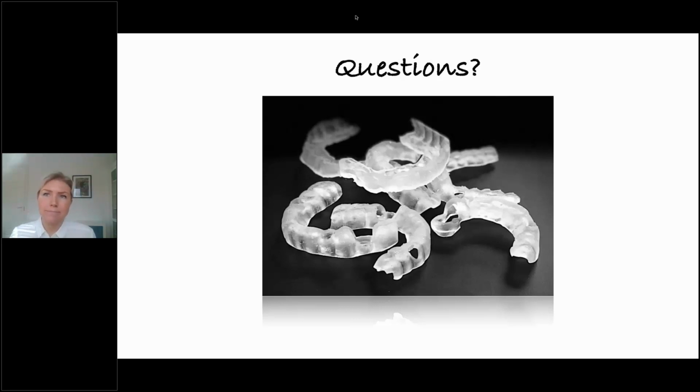So the answer is yes, you have to deal with scatter. You can play with the threshold settings on the volumetric rendering until you get the best balance of removing artifact but also keeping the data you need, and also having the incisal and cuspal data by taking the CT scan in an open bite. I can maybe think of literally one case where I was worried about it being merged accurately. Otherwise, I pretty much can get it to go every time.